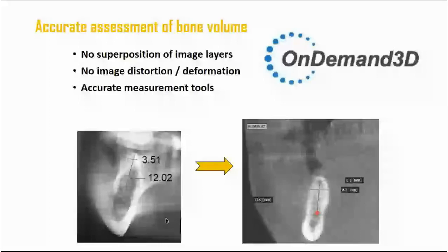But when we were going to operate, it was really like opening a surprise box. It could be a completely different thing. That whole technique was really a radiological operator sensitive technique, and you should have a really experienced operator to make at least an acceptable picture. So today we are looking at the right side.